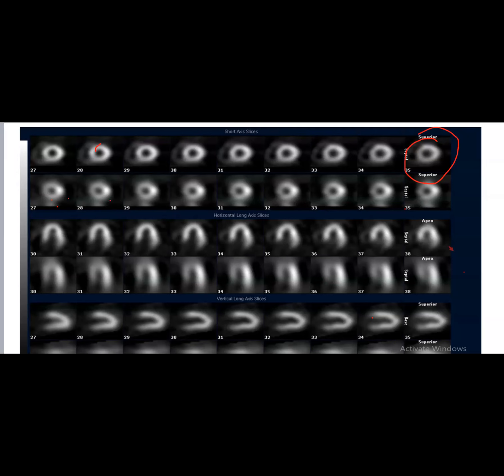Okay. Even if I have no perfusion defects, if I demonstrate a TID, that is significant in the absence of perfusion defects. Of course, in this patient there are perfusion defects. You look at the septum, if you compare this one here with this one here, the septum is clearly abnormal, or the anterior wall to some extent. But the TID is so pronounced here, and this is significant. So this is strongly positive. The patient should go for coronary angio, of course.